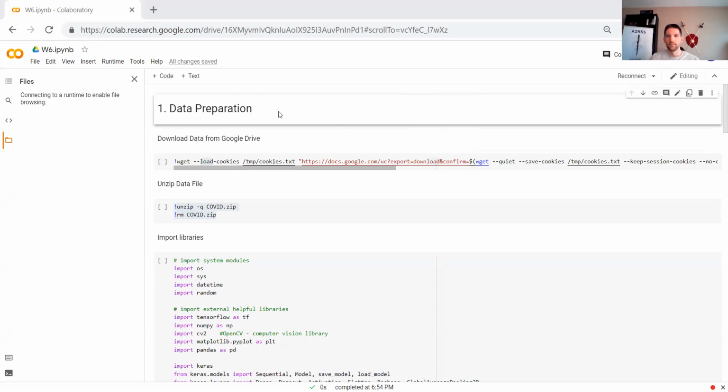So first, since we're working with X-ray images, these are now image data files. In previous workshops, we used a simple Excel list of data points. Those kinds of lists are really small and easy to work with. Images are quite large and you need lots of images to work with. Because the files are so large, you need more processing power.